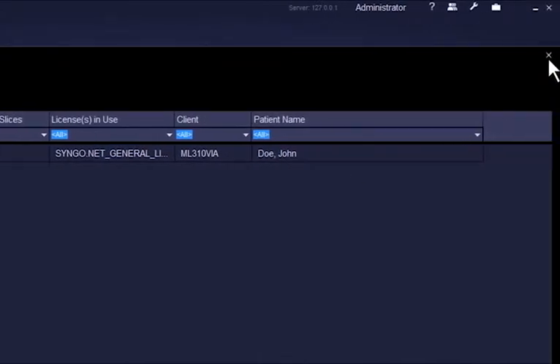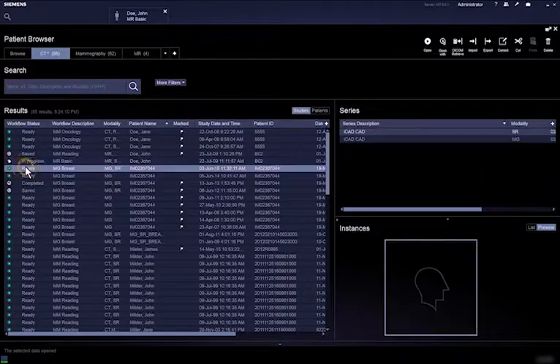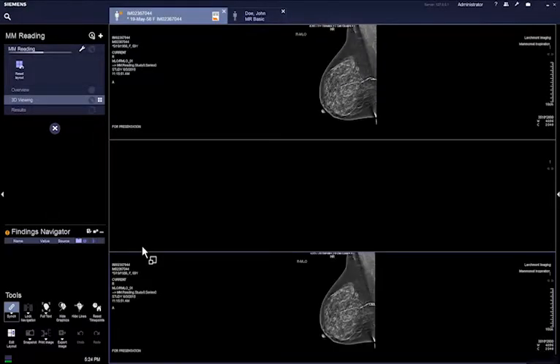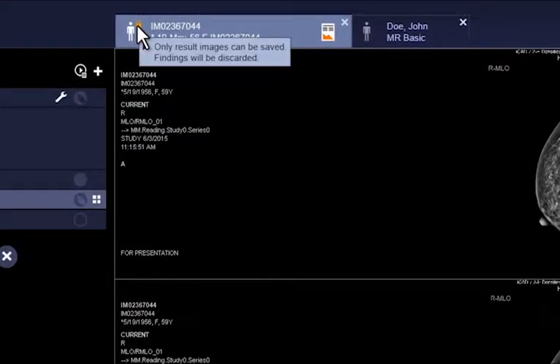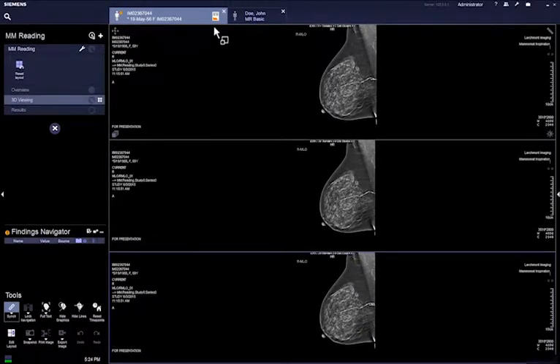Anyhow, if you cannot get the study closed soon enough, syngo Via still allows you to assess the case and save certain results when opening a study with the View as Read-Only option. This extended read-only mode is indicated by the orange lock icon and the absence of the completion button on the general area. The results can still be sent to the archive and will appear in the series navigator for the user who opened the patient first, but findings will not be listed in the Findings Navigator. Go to the cross icon on the Patient tab and select Save and Send.